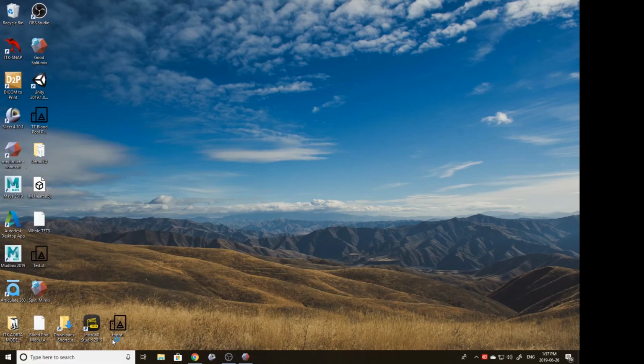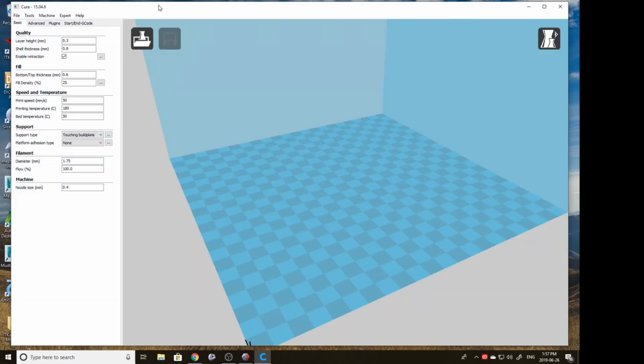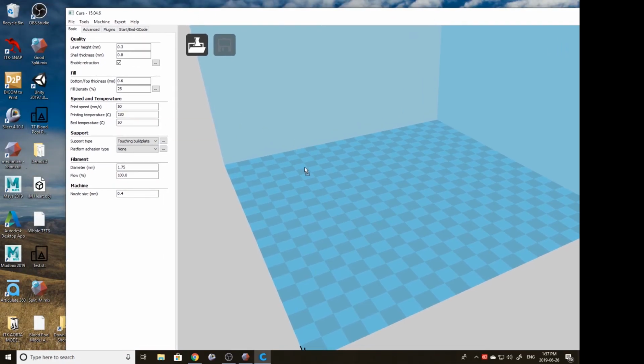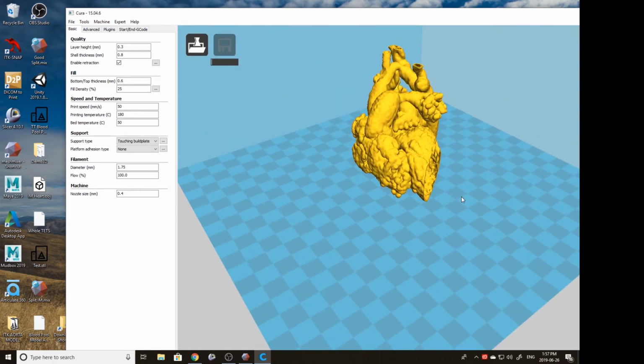Just for right now, I'll show you on Cura. And let's see here. Once this loads, we can take a look. And that's where we'll be setting everything up. I just want to show you guys what it's going to look like. Here's where you'll set up your supports. For our models, we're going to be doing a little bit more complicated ones in the future, so we are going to have to do stuff with a dissolvable support, whether that's through an FDM printer with 2 nozzles or some sort of PolyJet printer. I think that'll be really fun in the future.